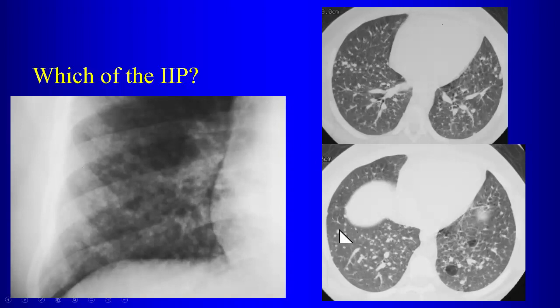What would you say about the distribution of the nodules? Well, you think that you would go with centrilobular for this distribution? What's the first thing we ask? You ask yourself, are the nodules touching the pleural surfaces? Yes or no? Yes. They are touching them. So what does that mean? Either perilymphatic or random. It is not centrilobular, right?